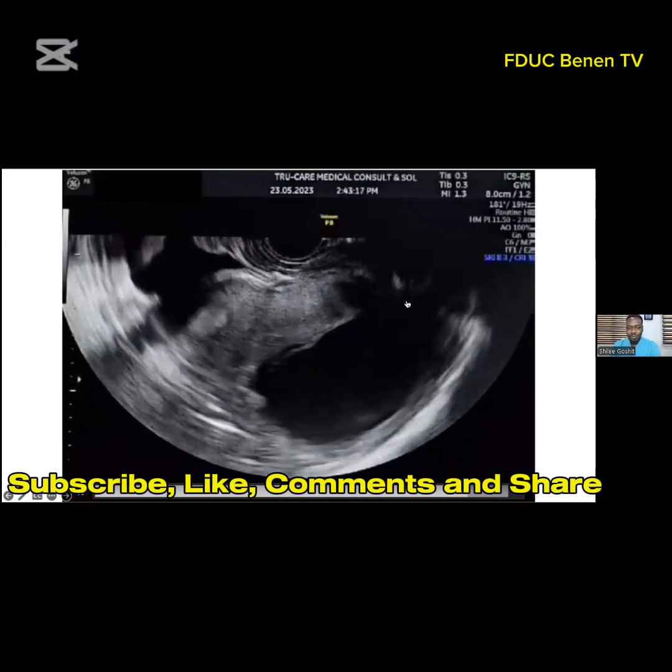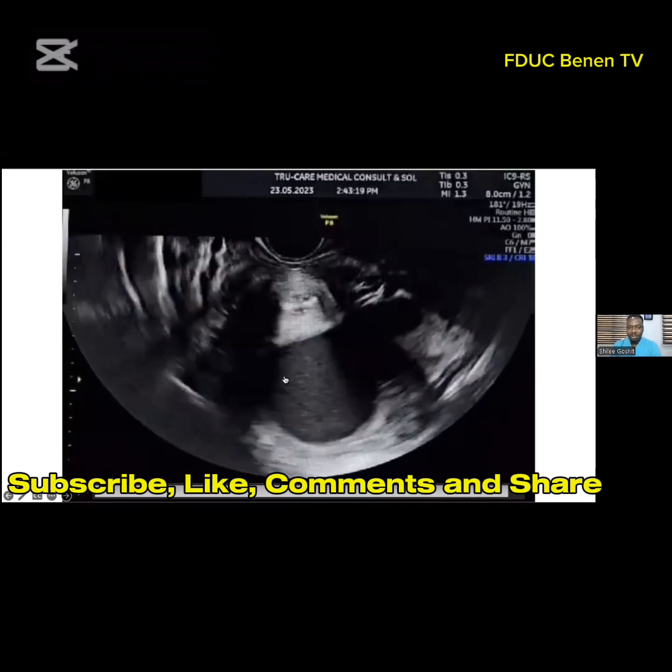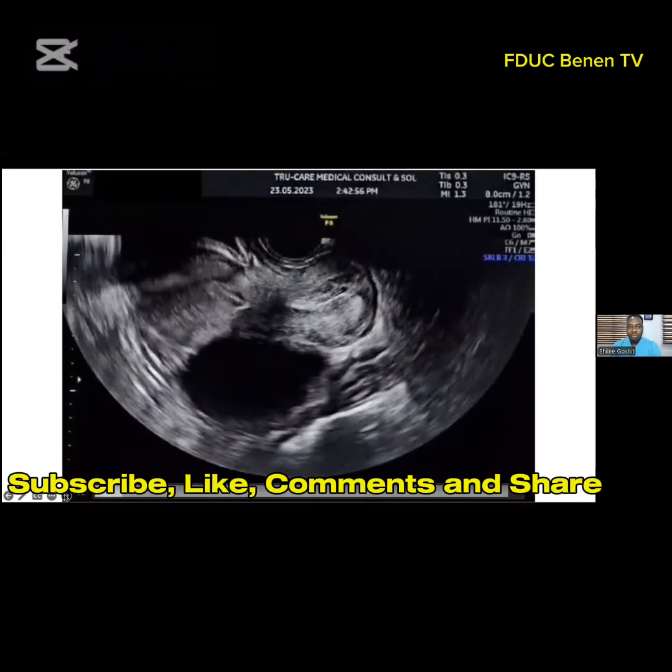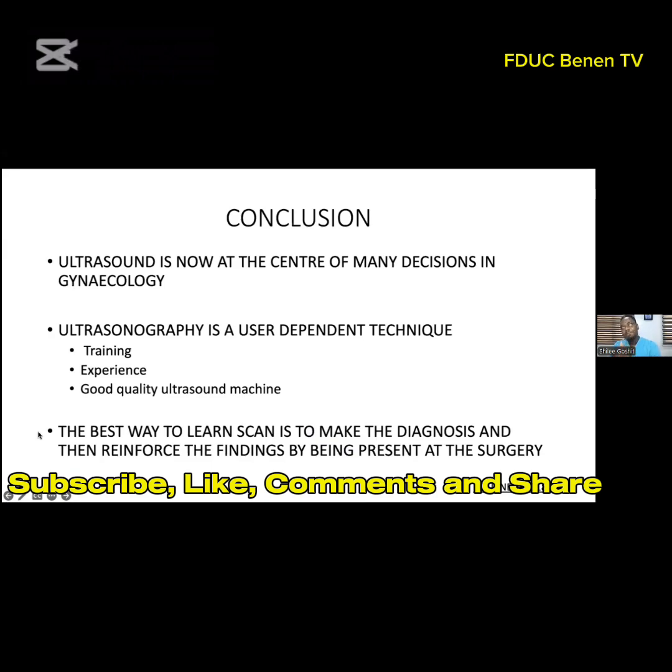And even when you evaluate further, this patient has advanced disease. So for endometriosis, it's not just the endometrioma you can see. We don't have enough time, but we would have shared images of the proper endometriosis deposits, and then you would see other things like the effect on the bowel, things like the Indian headdress sign.